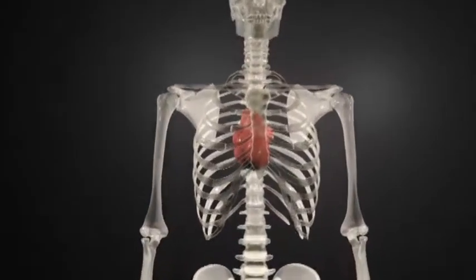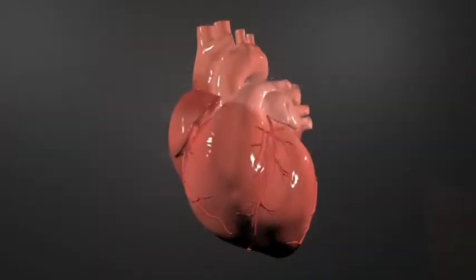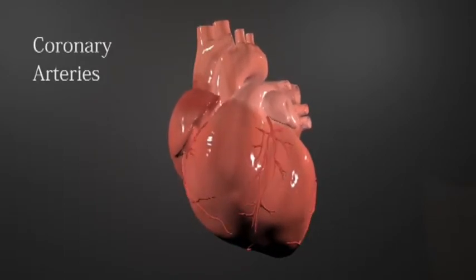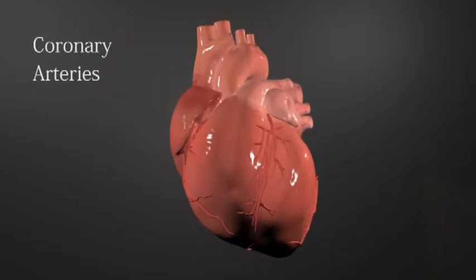The muscles of the human heart receive their own blood supply from vessels that branch from the aorta. These are known as coronary arteries. Throughout a person's lifetime, these vessels commonly become partially or fully blocked by a buildup of plaque, a process known as atherosclerosis. This will prevent sufficient oxygenated blood from reaching the muscles of the heart wall. This leads to symptoms of coronary artery disease.